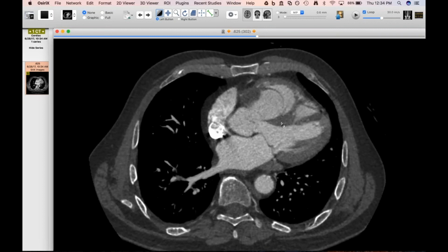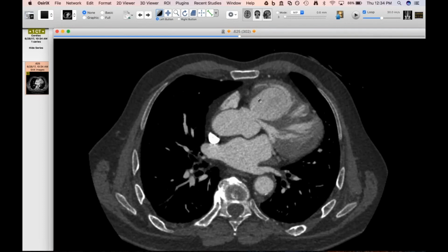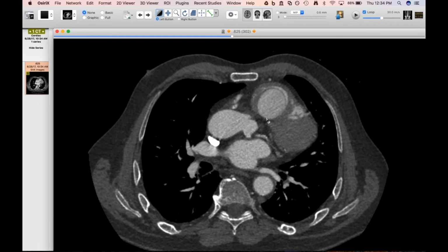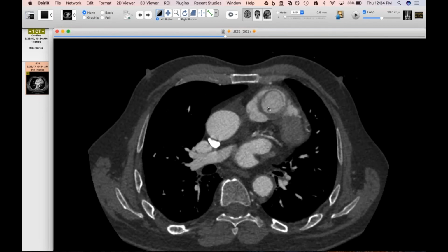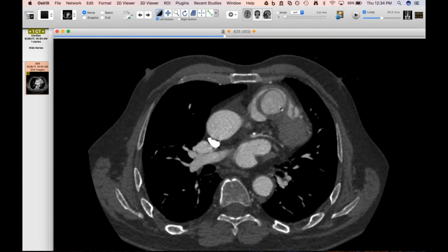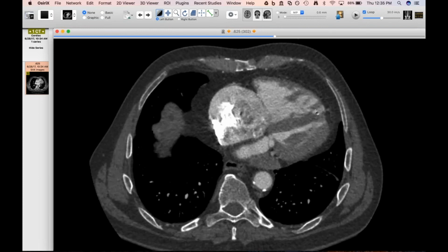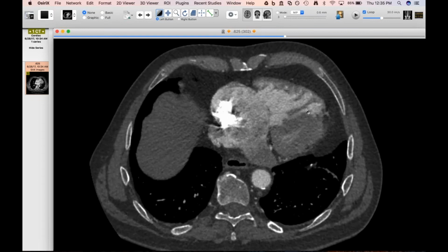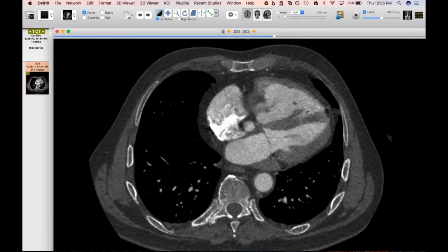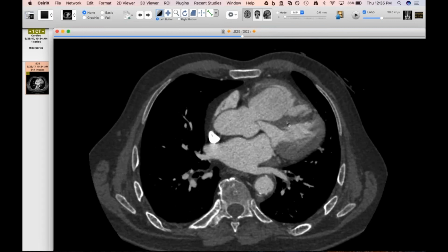And I haven't had a chance to look at the echo report yet because I was just shown this case yesterday, and this is a VA patient. But it's amazing that it's prolapsing into the RV outflow tract here. This is all the sinus of Valsalva aneurysm. And his right ventricle definitely looks a little dilated and maybe a little hypertrophied here. So I wouldn't be surprised if he has some degree of outflow tract obstruction from this. And it hasn't ruptured at this point.